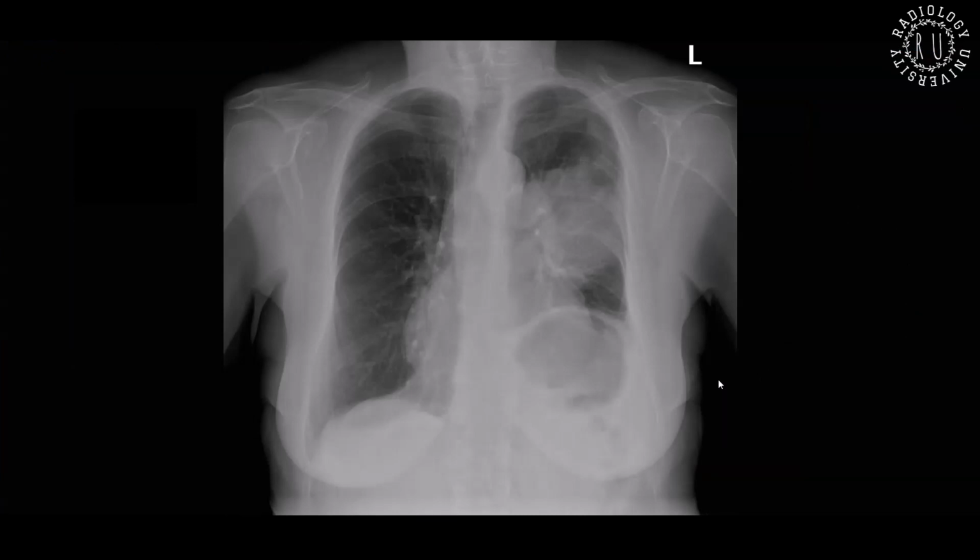I'm given a chest X-ray of this skeletally mature patient who presented with a cough. I noticed there is a mass lesion in the left mid zone having an acute angle with the mediastinum. So this is likely pulmonary in origin, I think. And there is an elevation of the left hemidiaphragm, and there's a reduction in lung volume of the left hemithorax.